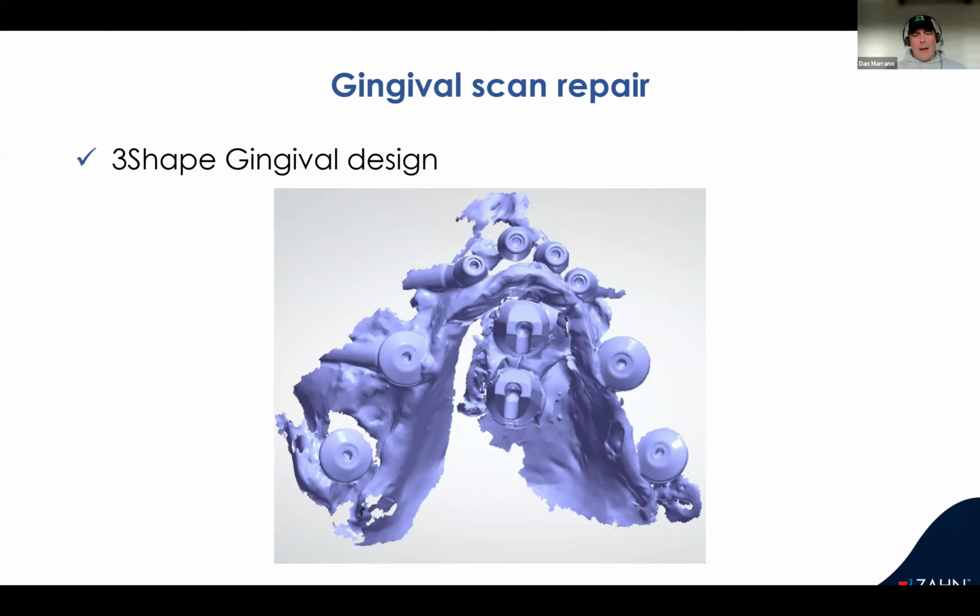I am not going to tell the doctor to rescan this. This is a surgery scan with three zygos, two pterygoids, transnasal, whatever else he put up there. He's had a long day. I'm not about to tell him, you need to go take me a new tissue scan. This scan is not even closed up. It's still open, as you can see.